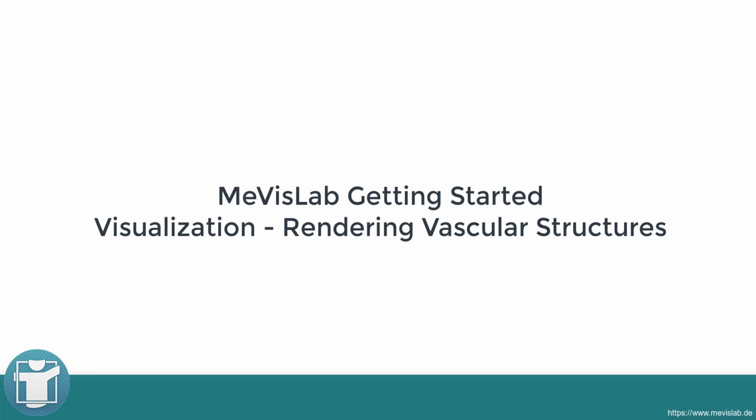In this video, we are using a bronchial tree input mask to create a vessel centerline calculated by the DtfSkeletonization module and visualize the vascular structures in 3D using the SoVascularSystem module. The second part uses the distance between centerline and surface of the vessel structures to color vessels depending on their radius.